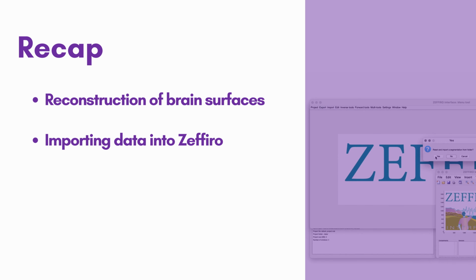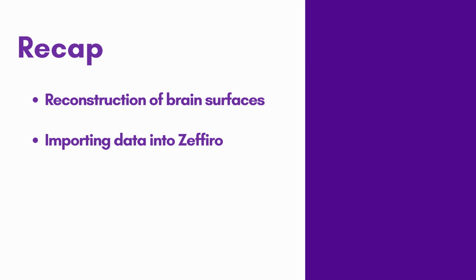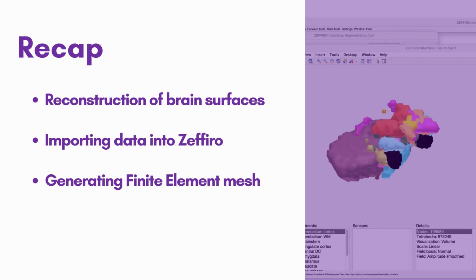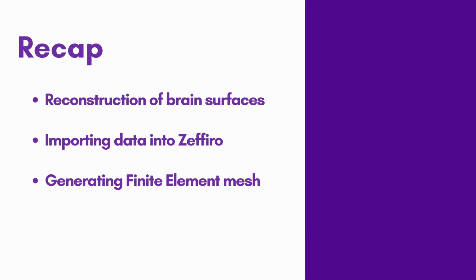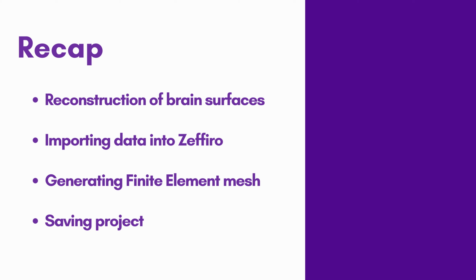Next, we imported this data into Zeffiro, the primary tool we'll be using for our optimization process. We then generated a finite element mesh. This provides us with a framework to precisely simulate complex structures of the brain. And finally, we saved our project for future use.